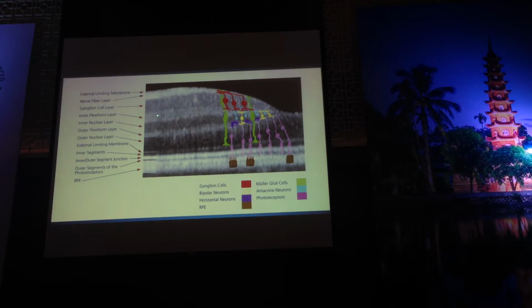The fiber in the plexiform layer is the same, because it is a synapse between the ganglion cells, and the yellow color here is bipolar neurons. The inner nuclear layer contains the nuclei of bipolar cells, amacrine cells and Müller cells as well.